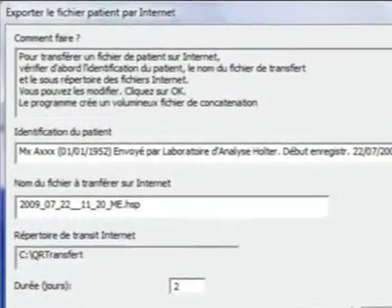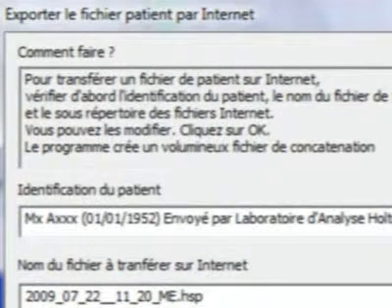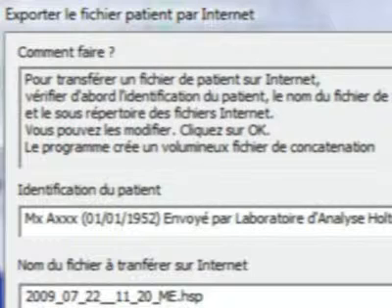If you hesitate to use certain functions, there are help menus available. Use How To Do in the dialog box, and read the electronic menu.